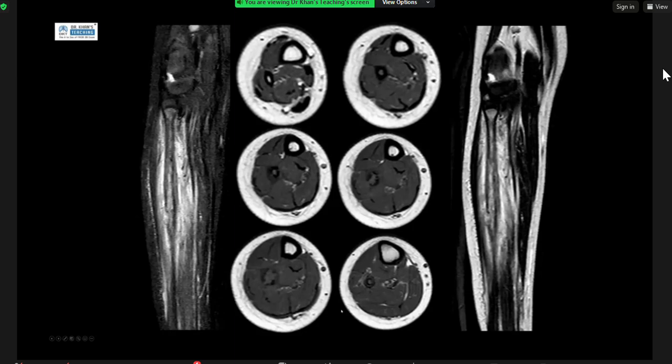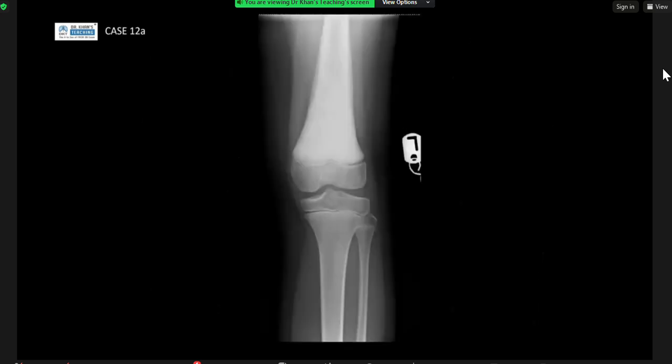The child went on to have an MR. I'm not sure the MR really helped to narrow down that differential. You can see how the LCH is actually quite aggressive appearing on the MR. So they were still worried that this was underlying tumour and ended up having a biopsy. So I'm going to move on. Candidate 2.